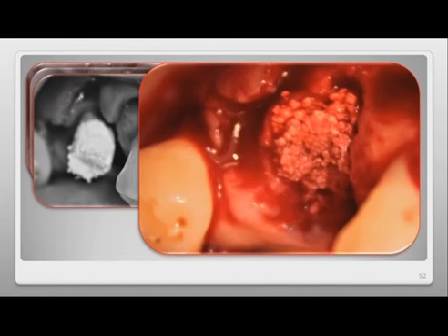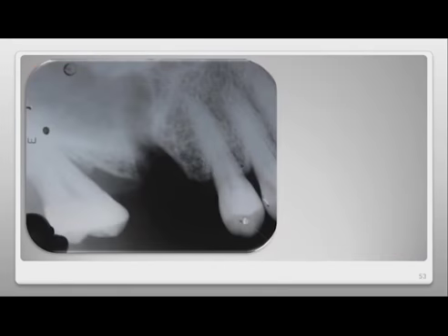The post-extraction X-ray shows us the filling material in this site. Here is the collagen membrane, and here is the material. Why can we clearly observe the material in some cases and in others not, as in this case? I believe, I must admit, that I probably didn't adequately deal with the material and that it remains, let's say, slightly mixed with the clotted blood, not with any space, but mixing material and the clot as it's not fully packed. This is a clinical judgment, and it's probably the cause.